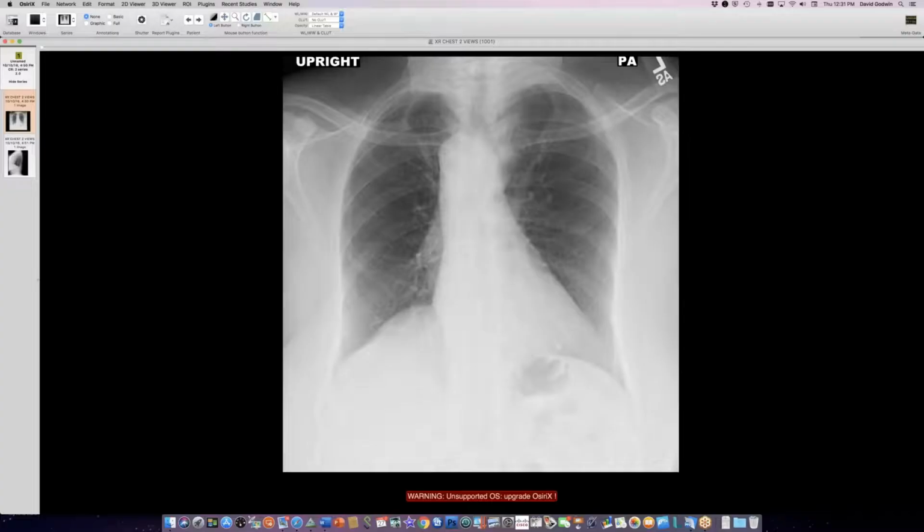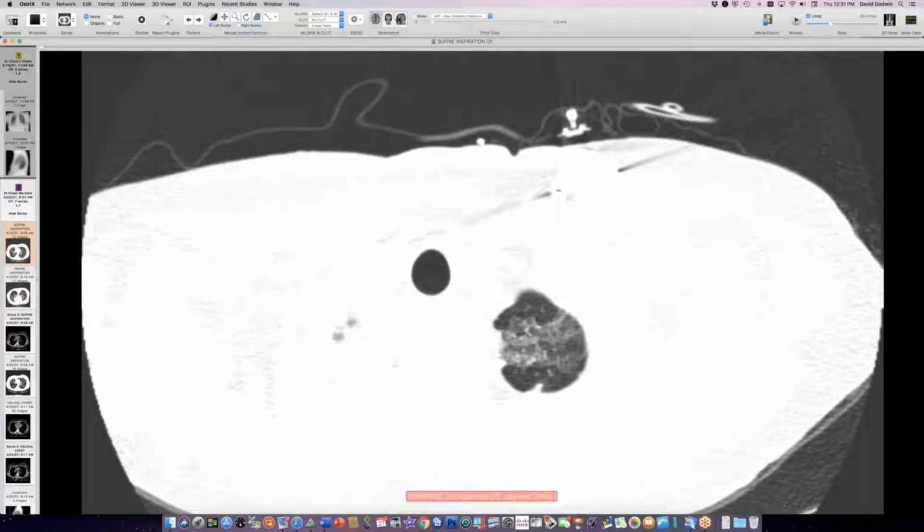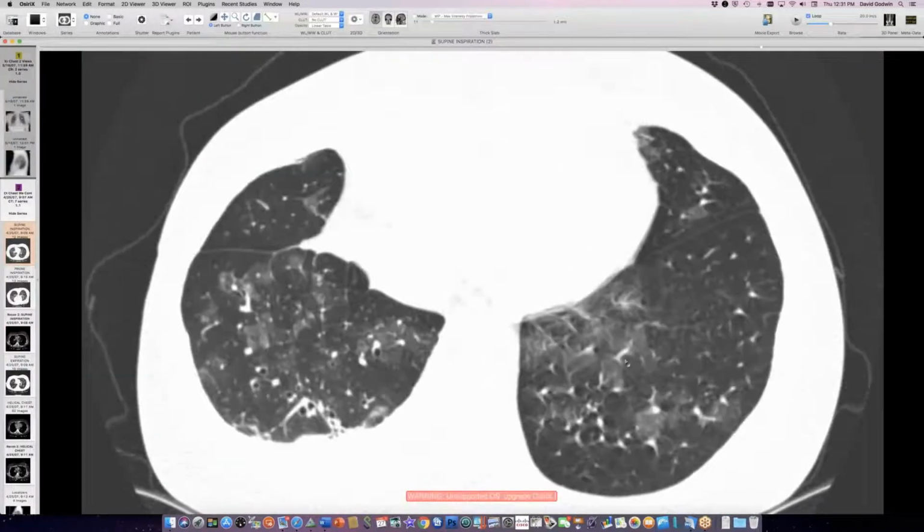Okay. Yeah, so that's really just hyperemia, right? It's not ground glass per se, because it's normal lung. That's just overperfused because the right is getting all the blood that should be going more uniformly to the lung, but it's being concentrated in areas. So you're right. And it's interesting. I've seen this degree of hyperemia in CTEPH all the time, but not in BO. I have to say I haven't seen this degree in obliterative bronchiolitis before. I see it all the time in the CTEPH cases.